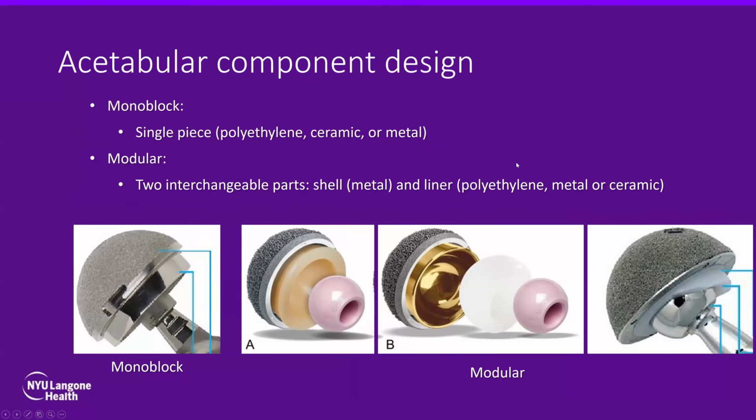Total hip arthroplasty has different configurations. It's important that you be familiar with these configurations, but nobody expects you to comment on the exact configuration in your reports. But to see the pathologies that can be associated with hip replacement, it's actually pretty useful to know what type of arthroplasty we are dealing with.